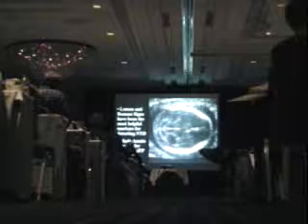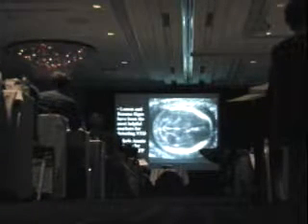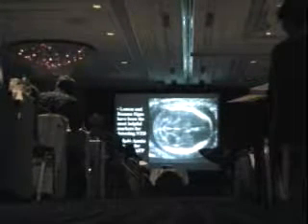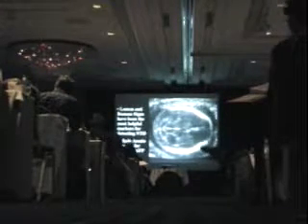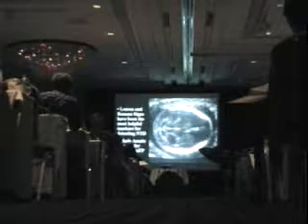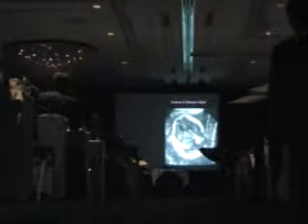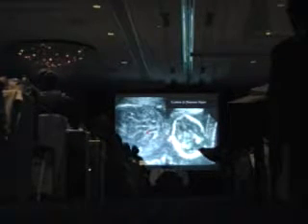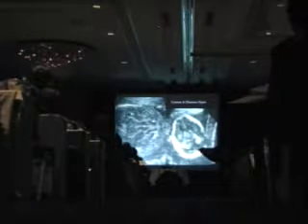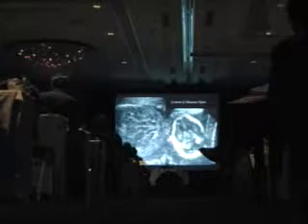So really, the presence of the head signs has made amniocentesis obsolete for the elevated MSAFP. Back when I started in ultrasound, I won't tell you how many years ago, amniocentesis was always done for patients who have elevated MSAFPs, even a little bit of an elevated MSAFP, because the pickup rate of neural tube defects was only reportedly about 80%. Now I'm glad to say it's much higher than that. And here again is an example of the lemon sign and a very severe banana sign. That's so severe that you can almost get the impression that the cerebellum itself is actually heading down the foramen magnum because of the Arnold-Chiari type 2 malformation.